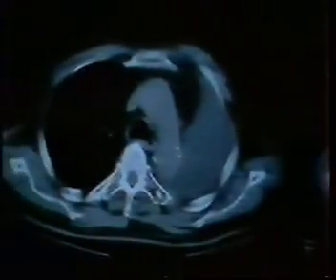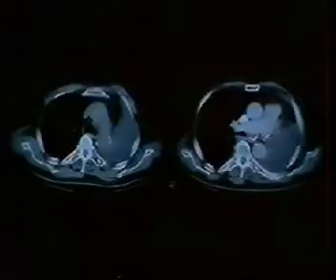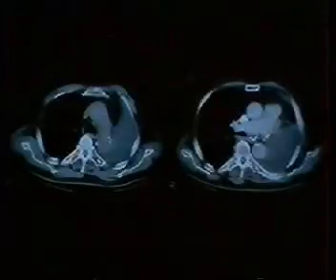These are two different cuts from a patient who's normal post-pneumonectomy, and as I've mentioned, the space tends to be relatively homogeneous, low attenuation, and concave along its medial margins. Where the surgical clips are, you can see there is no excess soft tissue, and everything on this scan in the central region is enhancing pretty well, typical of left and right pulmonary artery.